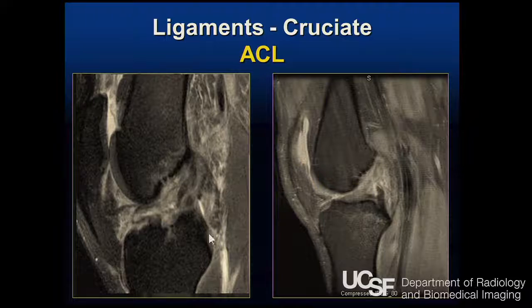There should not be edema within the intercondylar notch. There will frequently be a large associated knee joint effusion. People will describe that their knee swells up like a basketball very soon or immediately after the injury. And again, on a more chronic basis, you may not be presented with something like this, but you may see discontinuity between the fibers and some resolution of the intercondylar edema.